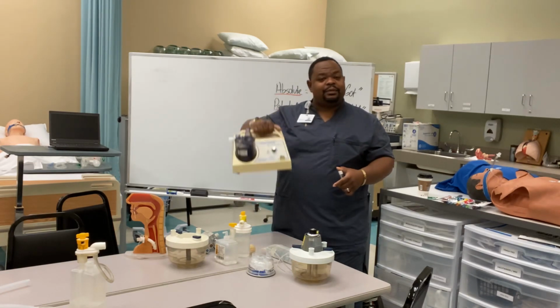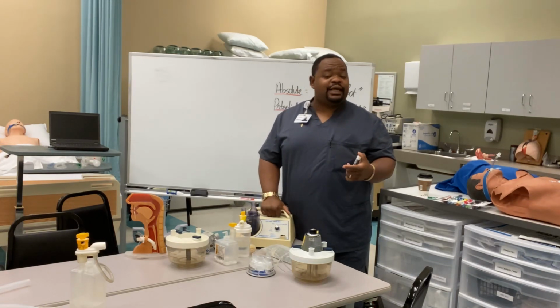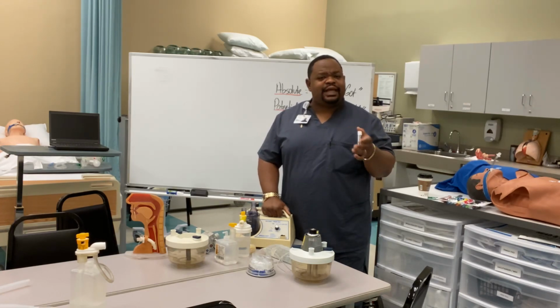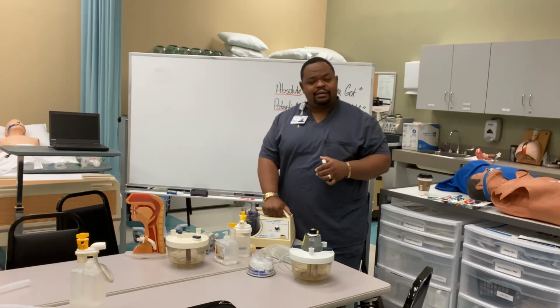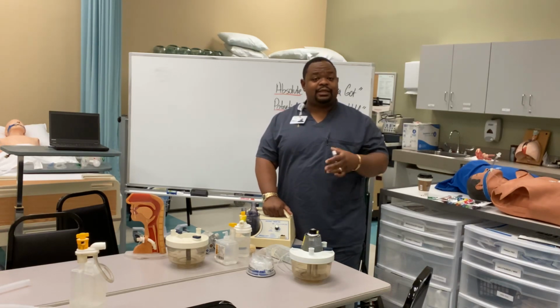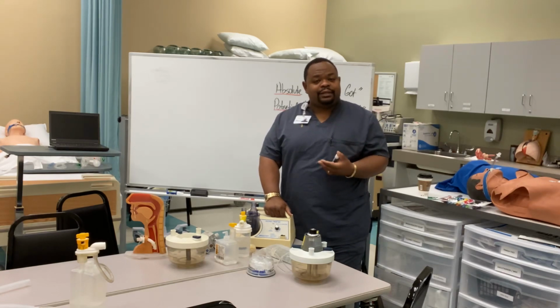This ultrasonic nebulizer can give you 6 cc's per minute. But what if I want to put this on a CHF patient, somebody who has pulmonary edema, right? I have to be careful. Somebody whose intake and output is positive 2,000-3,000 cc's, right? I have to think about that. I might want to hold off on some of these and use something different, okay? Because then I might add to their fluid intake and cause them to be drowning, okay?